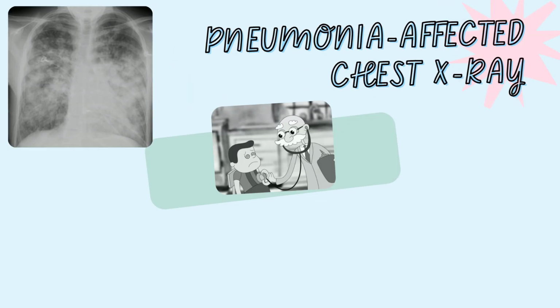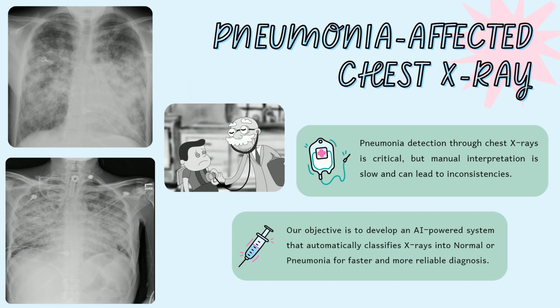Now, compare this with a pneumonia X-ray. Notice the white, cloudy patches in the lung area? That is the infection. Those patches indicate fluid or inflammation, a classic sign of pneumonia.